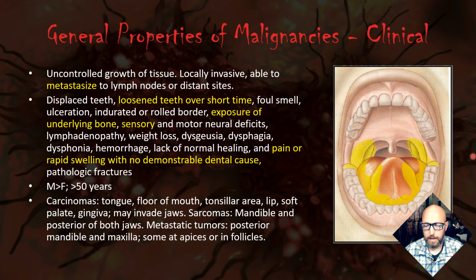These are typically soft tissue tumors, because the most common malignancy of the oral cavity is going to be squamous cell carcinoma, and that is a soft tissue tumor. And so radiographically, what are we looking at? We're looking at when it invades into bone. There are cases where you get malignancies that arise within the bone. We call that a central lesion if it arises from within bone.